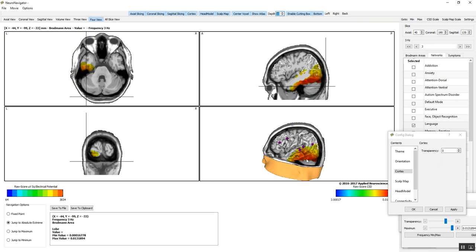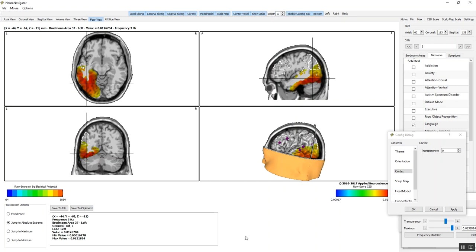This probabilistic event is much higher deep in the cortex, in the layers of the cortex, layers 1 through 6, than it is in the very upper part of the neocortex in the left temporal lobe that we see here. So this is the example, and it's available to use by clinicians to evaluate their patients in great detail.